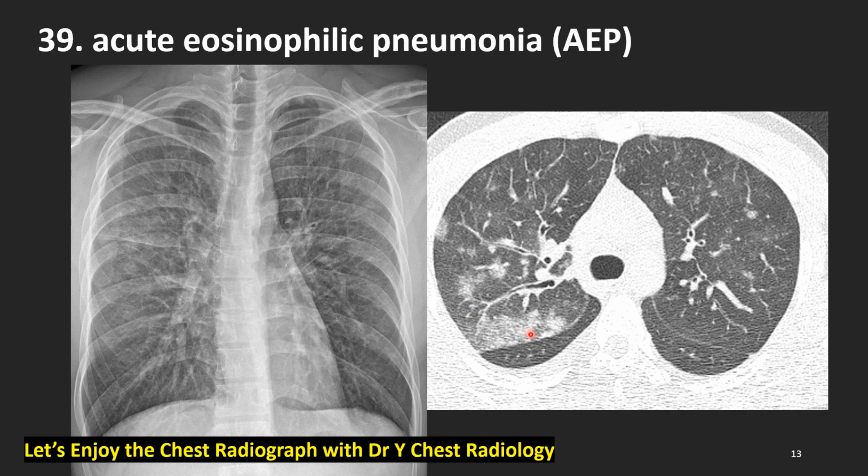On the CT, we see bilateral small pleural effusion, interstitial edema, bronchovascular thickening, alveolar edema, septal thickening of interstitial edema. It is a transient disease, usually occurring from first exposure to smoking and surely relieved, surely going away.